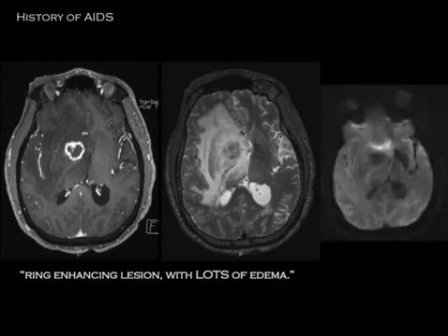Okay, so let's look. And it's not restricting diffusion. So how's that helpful? Okay, so it's not a tumor, well, not a hypercellular tumor. It's not a stroke. It's probably not a hematoma. It really looks like, I told you this is a guy with AIDS, so you're thinking that it was an infection.